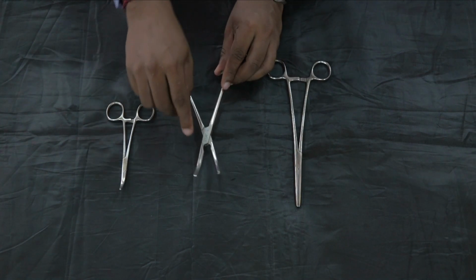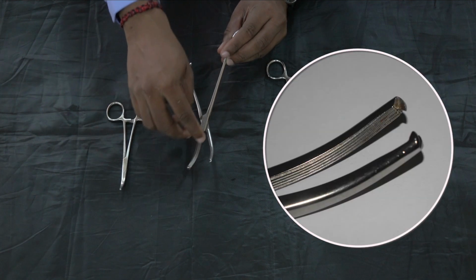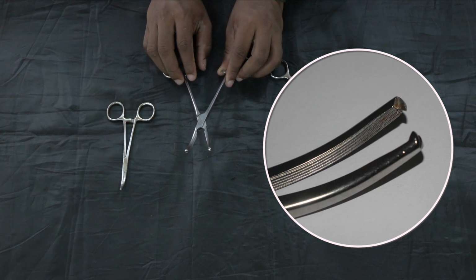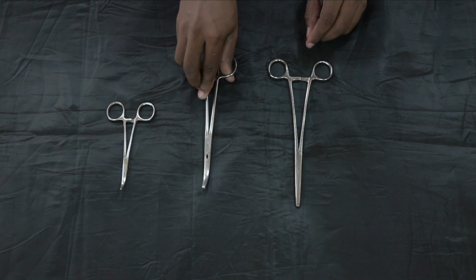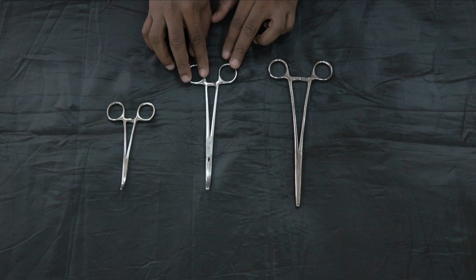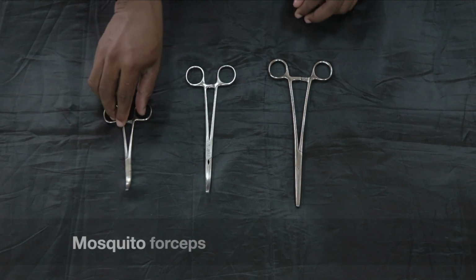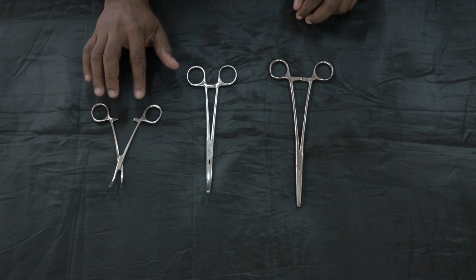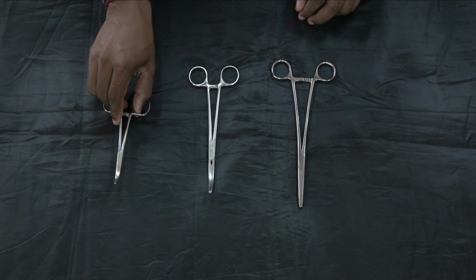And again, inside the jaw, it is specially designed with a longitudinal ridge and a sharp tooth tip, which also helps to tightly hold the tissues with the blood vessels. This is commonly used to clamp the uterine arteries during the hysterectomy. This is a small hemostatic clamp we call a mosquito, which also holds the tissues and the blood vessels, and is used in a superficial plane.